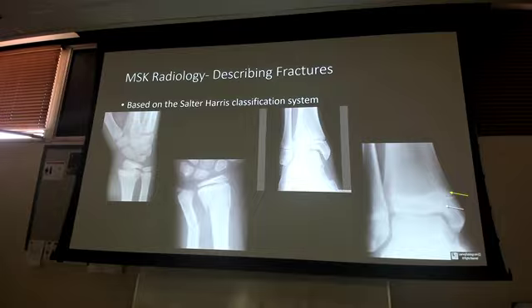Okay. 3, through the physes and down into the epiphysis. The yellow line is raised a little bit high so you can see the physes in there and down into the epiphysis. That's your 3. And then 4 is both, and it can be that subtle. The yellow arrow is a fracture of the metaphysis and the fracture in the epiphysis. I had it through both, so it's a Salter-Harris 4. And I didn't give you a 5, because you're not pediatric radiologists.